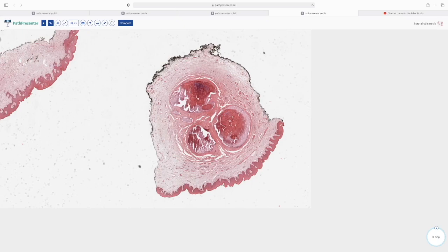This is a lesion that we'll be discussing. First, we have to identify what the site is. Obviously, it appears to be skin. At low power itself, there is a kind of muscle here, smooth muscle here. So we have to know in which areas of the body there is muscle just below the epidermis. This is the epidermis. Just below the epidermis, there is this muscle.